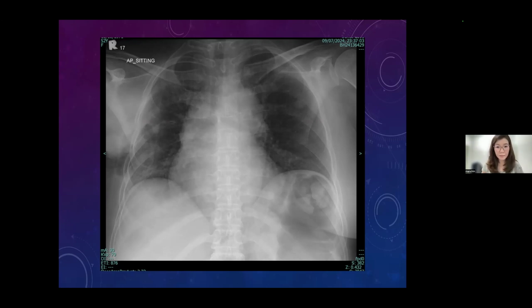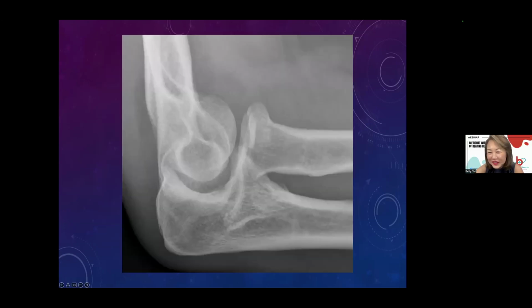All right, next. Interesting, orthopedic. Orthopedic, I really alert for. This is an easy one. Hurry up, guys. We want to do as many as we can. Now only going to the 17th X-ray.